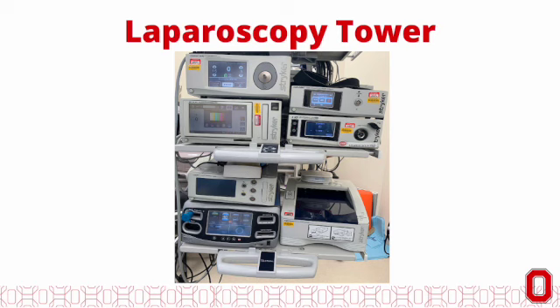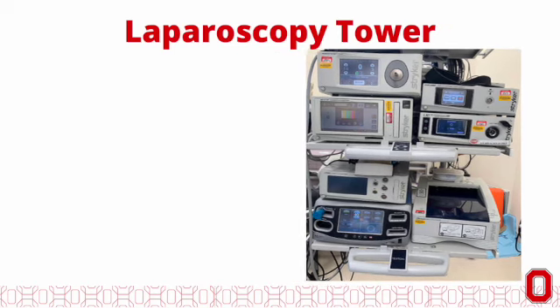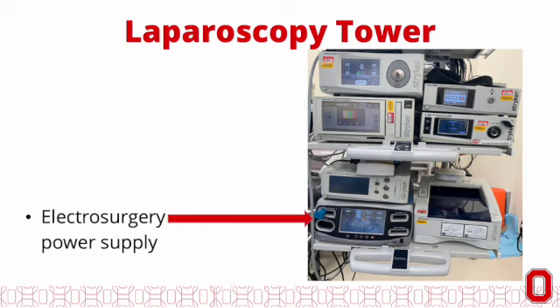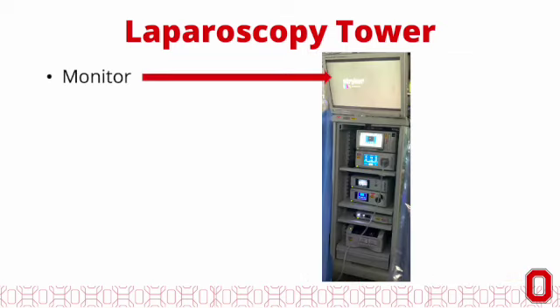This is the laparoscopic tower. It houses a CO2 insufflator, light source, camera, and electrosurgery power supplies. Atop the laparoscopic tower is a monitor for controlling settings and viewing the operation.